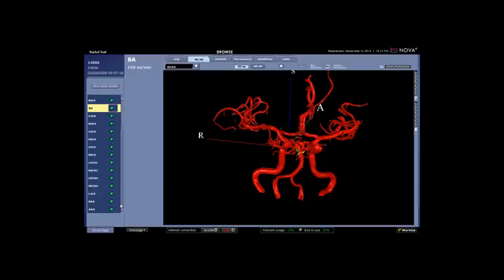So this is a quick tour of the NOVA report. We've looked at a Veritas protocol and the 3 measurements that would be taken in that study that's less than 5 minutes. And this study is about to be published, but it's an algorithm that would apply to, in the US, about 200,000 posterior stroke patients each year that would benefit from this 5-minute study.